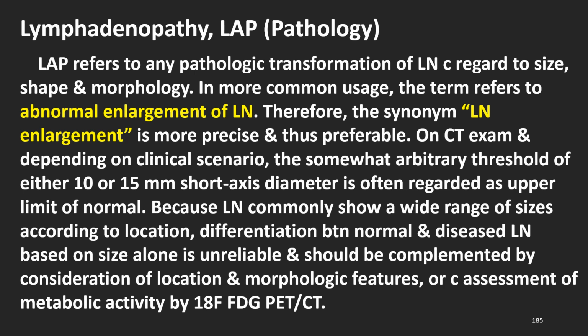Because lymph nodes commonly show a wide range of sizes according to location, differentiation between normal and diseased lymph node based on size alone is unreliable and should be complemented by consideration of location and morphologic features or with assessment of metabolic activity by FDG PET-CT.